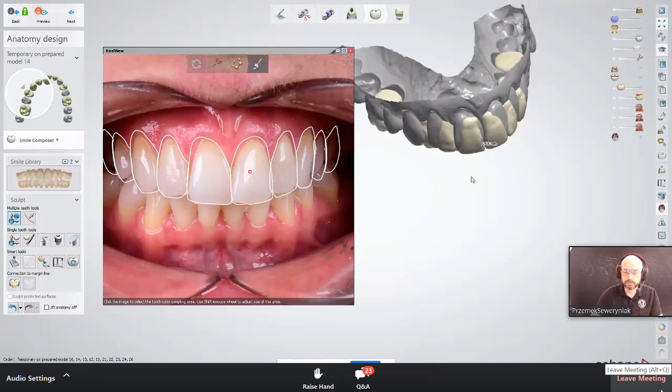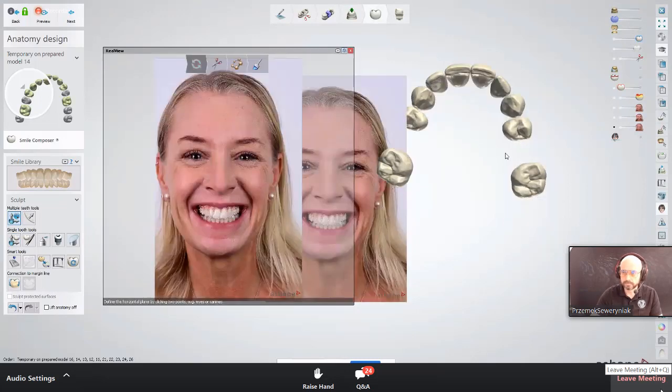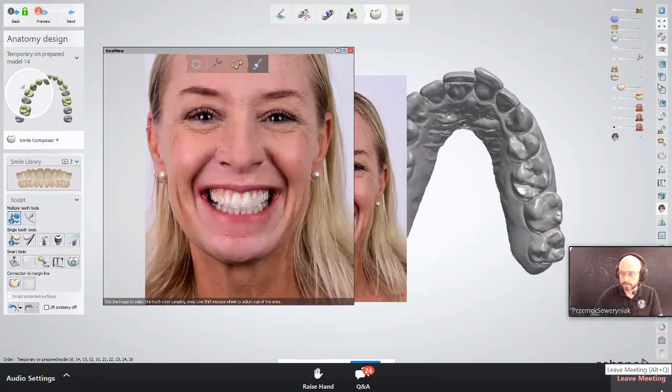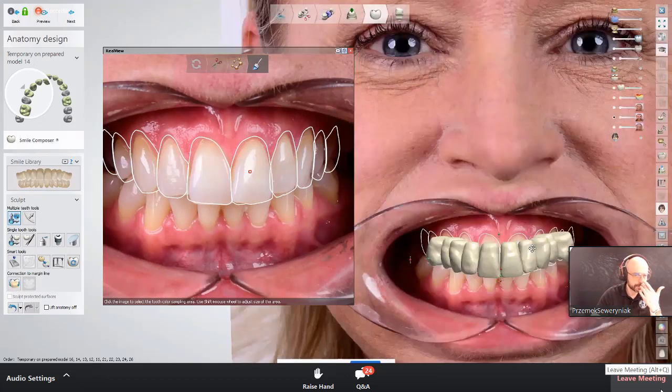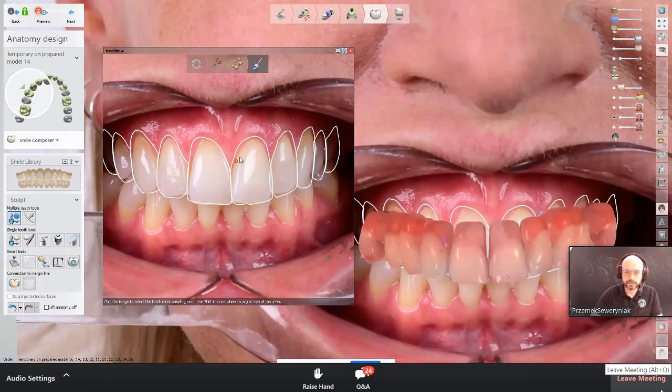Like this. I'm going to change that probably later on anyway, but just for you to see. Oops, wrong picture. Okay, so I still haven't started designing yet. However, if we put on the texture from the library, then this triangle basically changes the color from it, and you can change the size as well.